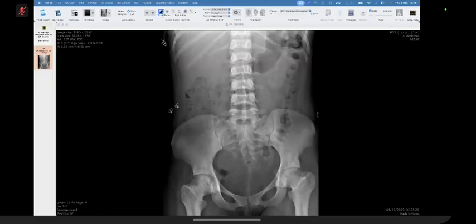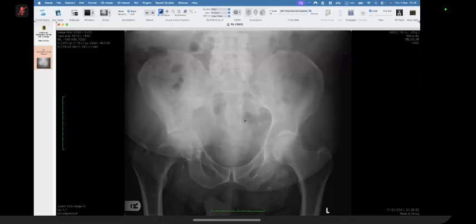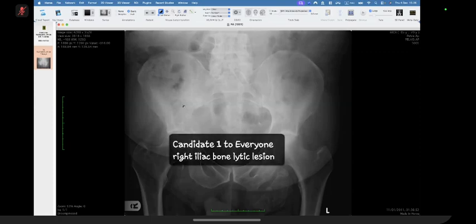Learn to see where the case ends. This is unfortunately a clear fail. And this is a difficult case for me to define. I was reflecting on how to evaluate you, because you picked up the myositis ossificans, and we'll come to that. But what you haven't picked up is this patient has got a big, large lytic bone lesion with soft tissue mass hiding in there. I apologize for saying this, but you can't argue that the windowing is not appropriate. It's got nothing to do with windowing.